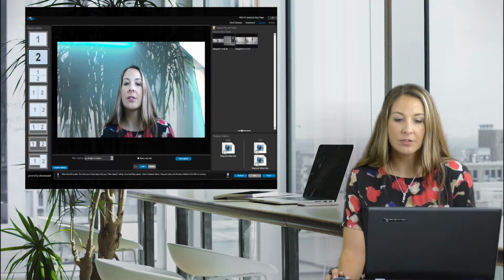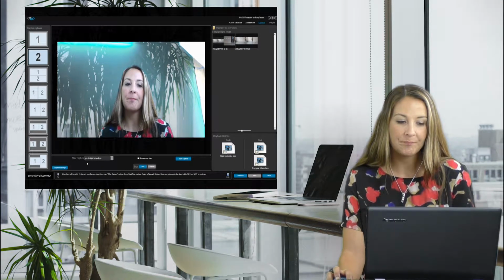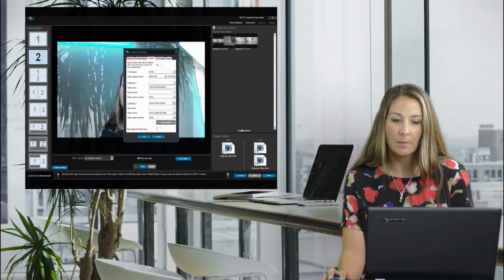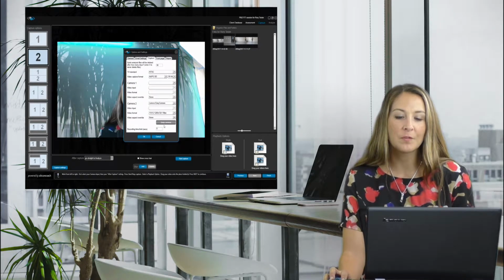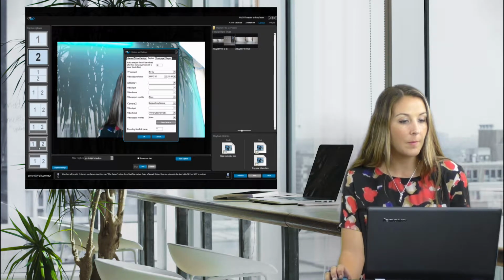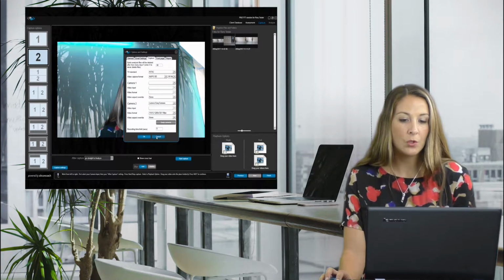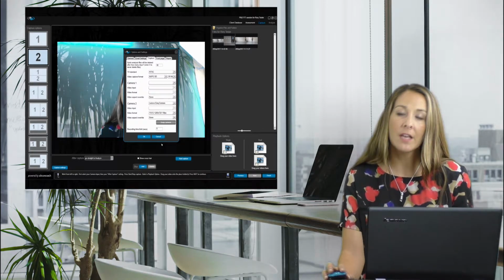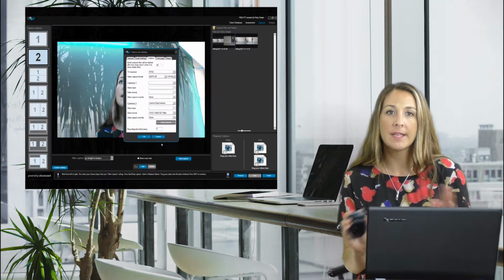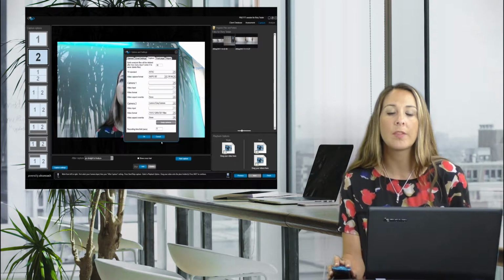And this again is the screen that comes up that shows you me here because I've got a webcam. But if I had cameras, I could go to capture settings and I could use different cameras that I've got set up. Since I'm using my cameras for my webinar, I don't have those to show you today. But we have all of these different views of how we can capture our videos and use those for our analyses. Again, because we have the ability to stream 2 videos at once, we can put them side by side. We can put them in different views because of coronal and sagittal. We might want them in different views.